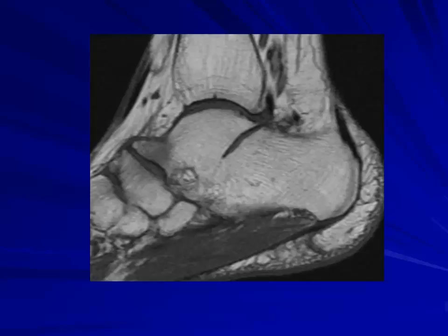Probably, I think for spine, it's exactly the same. When they fix it, that is the main problem: what has been solid, what has been incomplete, and then you need to look at it with the background of metal, and then you need to tell them whether this is the area which is causing the problem.